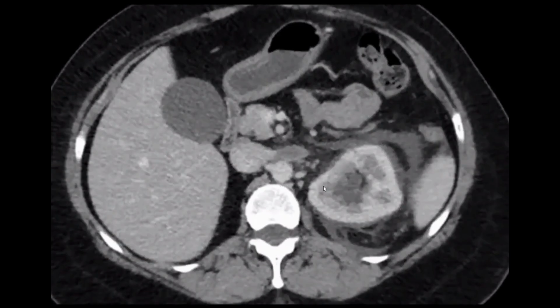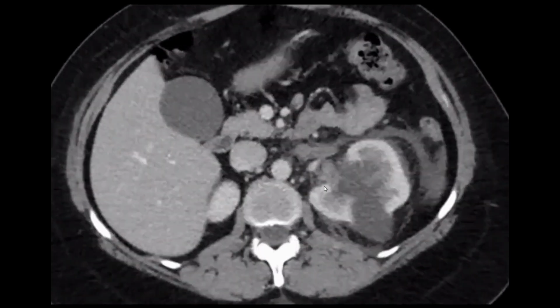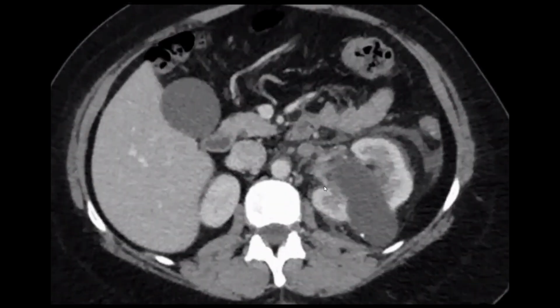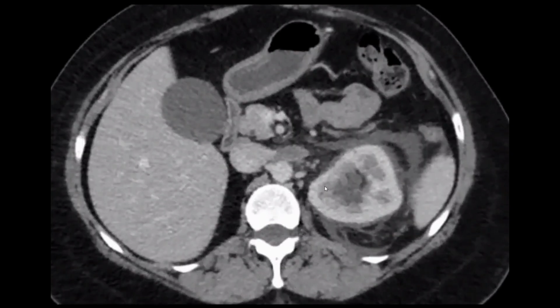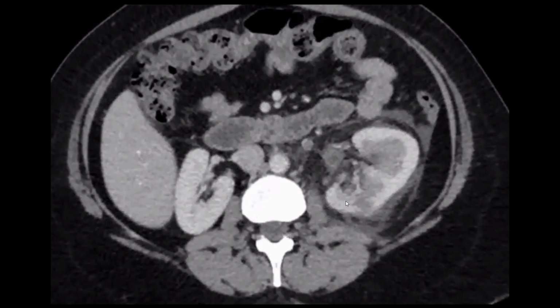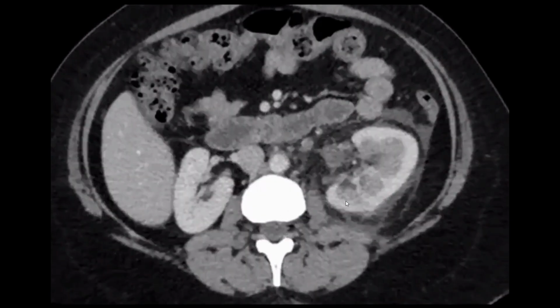When we injected contrast media, it appears hypodense, with filling defects inside the left renal vein and gonadal vein. So we have a case of acute left-sided renal vein thrombosis and gonadal vein thrombosis with secondary engorgement and a swollen left kidney. Can you please comment on the difference between the left kidney and right kidney regarding enhancement? Are both kidneys similar in enhancement?